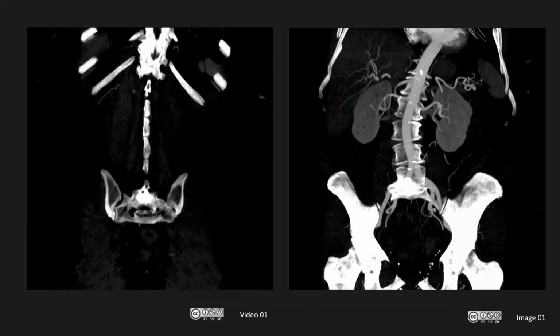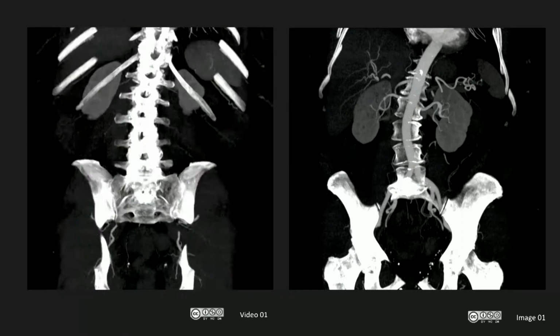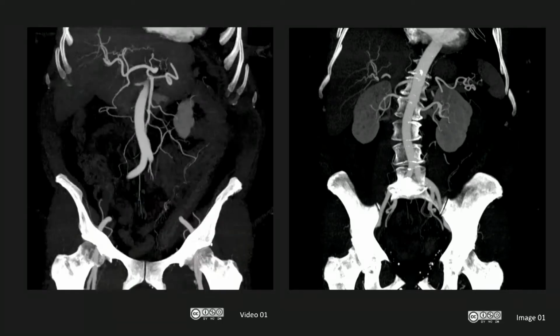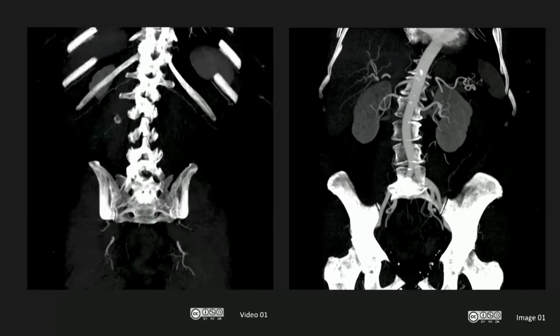On the left-hand side, we can see a loop through the 2D slices of a volume. The MIP reconstruction of the slices surrounding the kidney is shown on the right-hand side. Note that in the video we can see only some of the blood vessels in each frame, while in the MIP reconstruction we can see all the blood vessels in a single image.